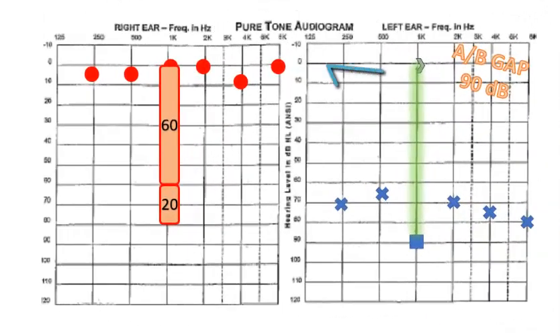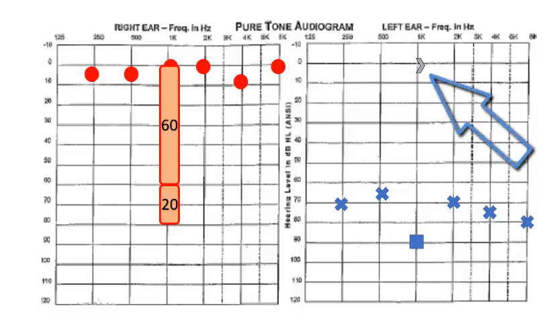Hold on again. That's an unmasked bone conduction threshold, which could be coming from the right ear. It's not possible to know if it's a true air-bone gap, and therefore we can't make a claim to know about the IA situation. Regarding bone conduction in the left ear, there are two possibilities for the unmasked bone conduction measurement at 1000 Hz. It's either an accurate measure of bone conduction hearing in the left ear, or it's not. If it is an accurate measure, then we know the IA must be at least 90 dB. Let's take a look and see what happens if it's not an accurate measure.